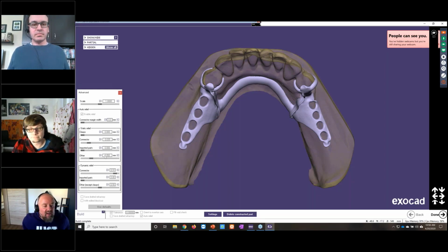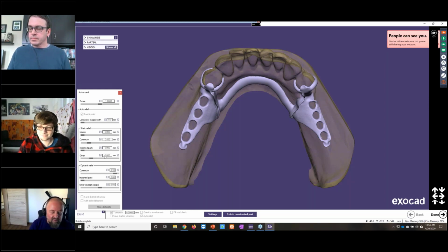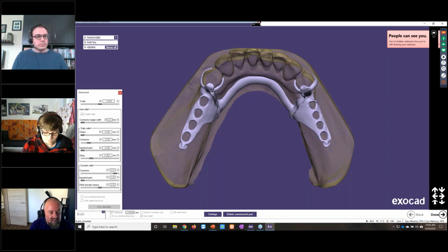There's actually a very nice video and presentation by Vincent, the developer of the software. It's anywhere on YouTube. It's really explaining especially the dynamic relief. It's quite hard to explain and also hard to understand, because this is really very mathematical and engineering stuff. So let's say the static relief, this is very easy. Here you can define offsets between different parts of your partial with values measured in millimeter. And the dynamic relief, this is just a percentage.